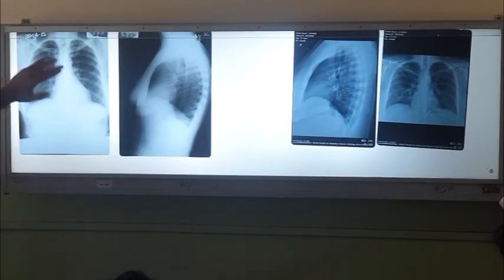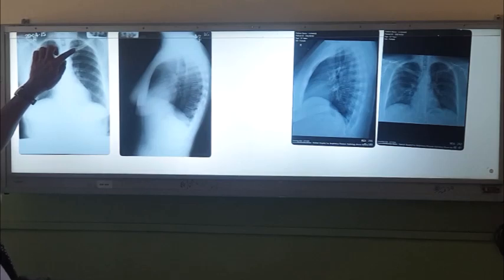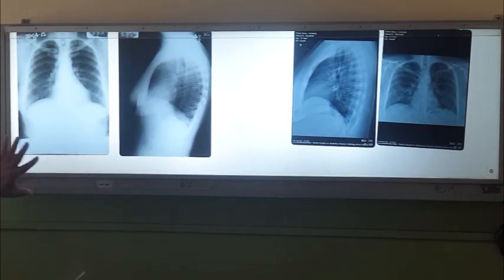The X-ray beam goes like this, so the scapulae and clavicle come up, and you can see the lung apices clearly. Sometimes if you suspect fractures here, you can ask for an oblique view, in which you can see the rib fractures clearly.